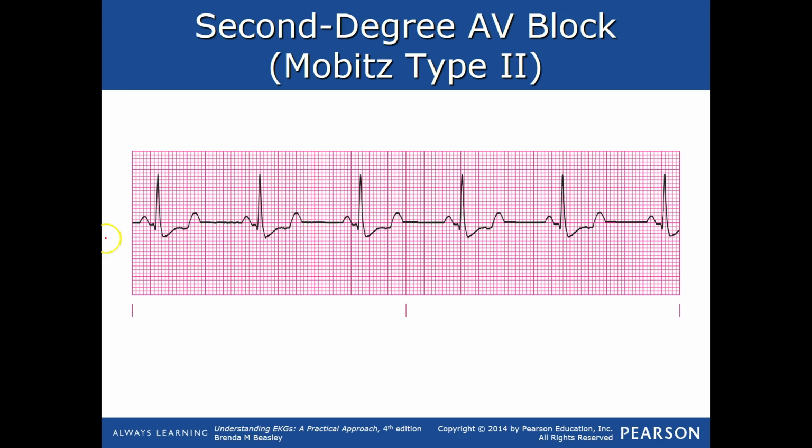Okay, let's go ahead and look at this one more time. So once again, we didn't take a look at that actually. Hang on. So here we have 1, 2, 3. So this is 3 to 1. Okay, so Mobitz type 2 with 3 to 1 conduction ratio. If you chose to say the conduction ratio, that's up to you. You may see that on a question, so make sure that you're aware of what it is, or if somebody asks you that question. But more than likely, we're probably not going to do the conduction ratio. The higher, though, as you can imagine, 2 to 1 is not as good as 1 to 1, right? 3 to 1 you can kind of think of as sicker. As we get into 4 to 1, you're going to have a lot less perfusing beats.